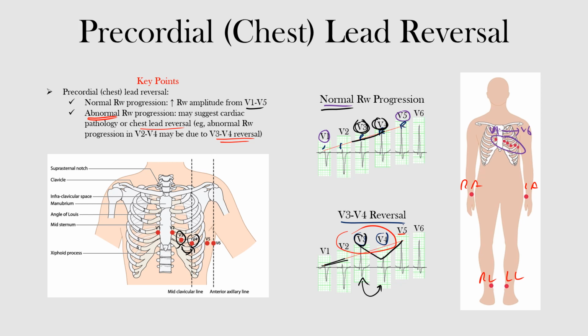Hopefully that's making sense, and it's not as hard as some of those limb lead reversals. Well, that's the end of this lecture. We discussed precordial or chest lead reversal and how to identify it on the EKG. I hope you learned something.